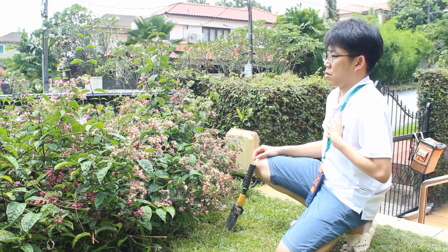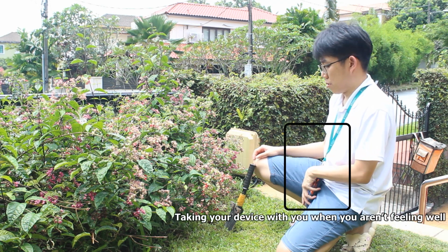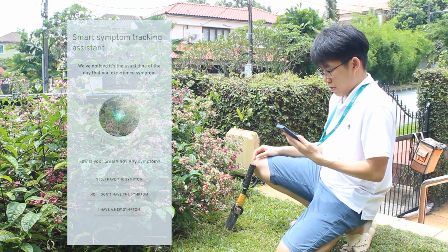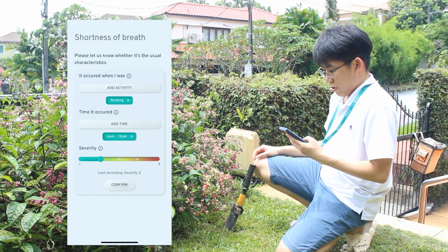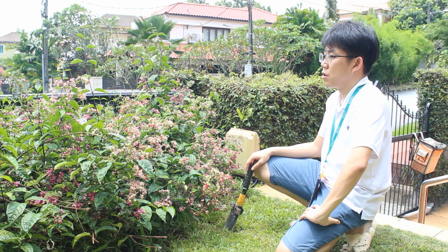Patients can bring their smartphone during their usual activity in which they typically experience their baseline symptoms. For heart failure patients, this is important because the severity of their symptoms within the activity that occurs can help indicate whether the symptoms change due to a worsening heart failure status.